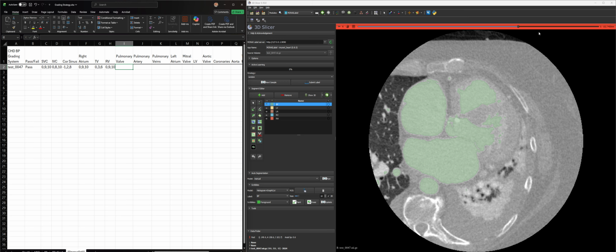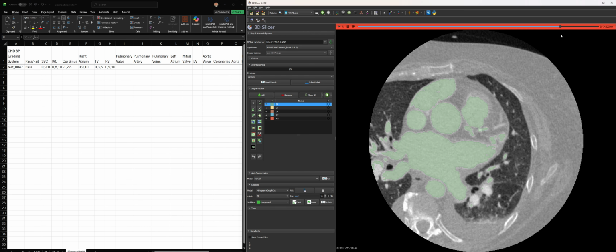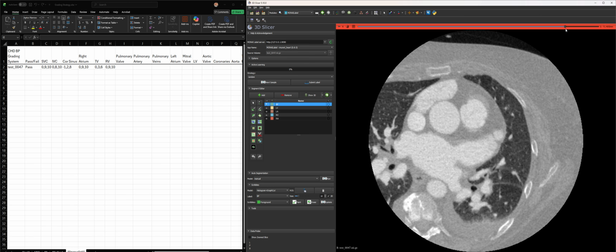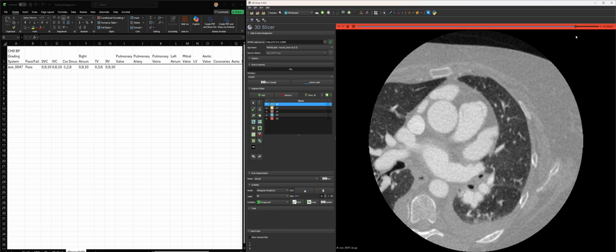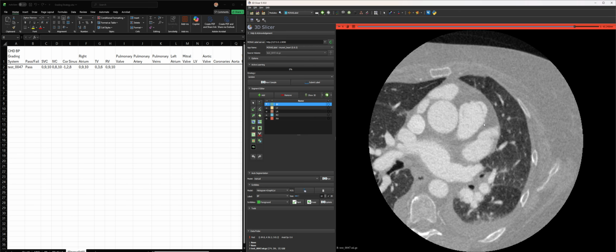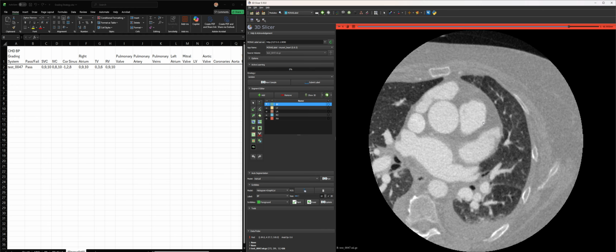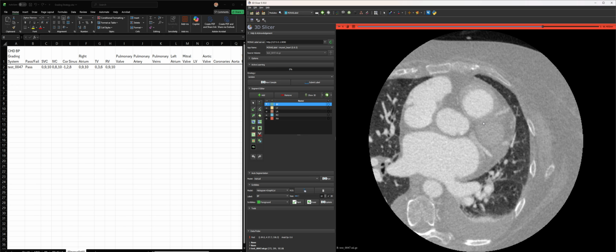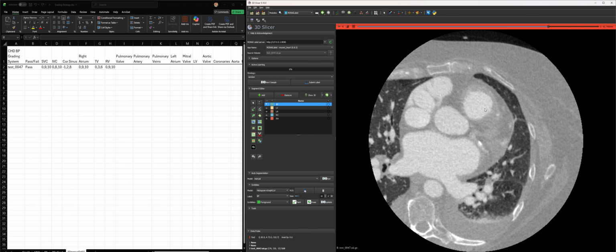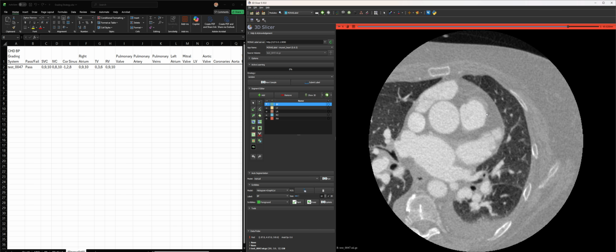Pulmonary valve. Pulmonary valve rarely shows up on the imaging. Let's see how this looks. And again, I'm going to take the contrast off to see how much I can see. And here's a little bit. That's actually some of the valve leaflets as they're open. I think this may have been acquired in end systole rather than diastole. The aortic valve's not going to tell us anything about that because it's all crusted over with calcium.